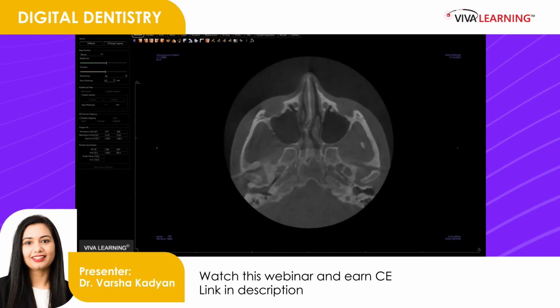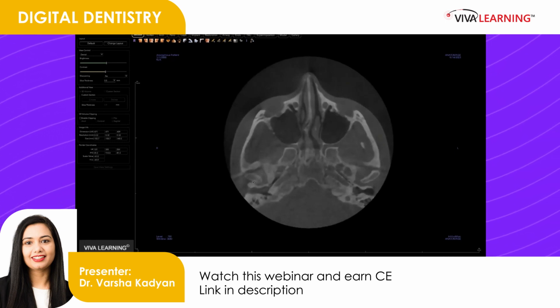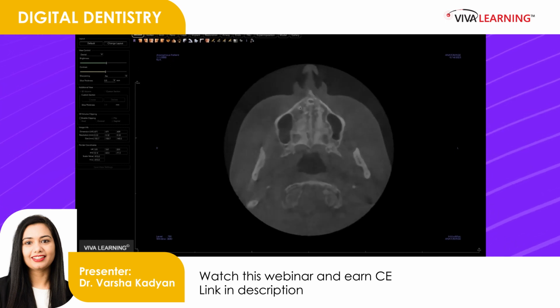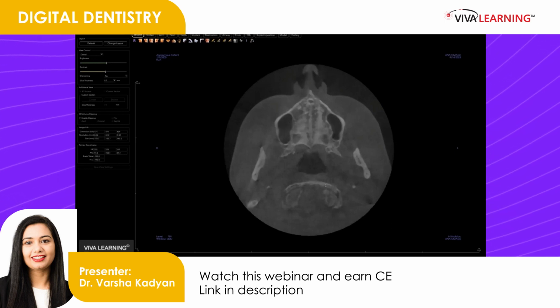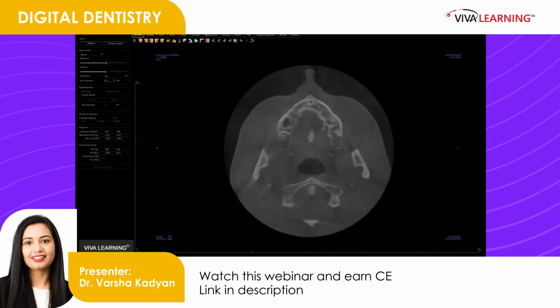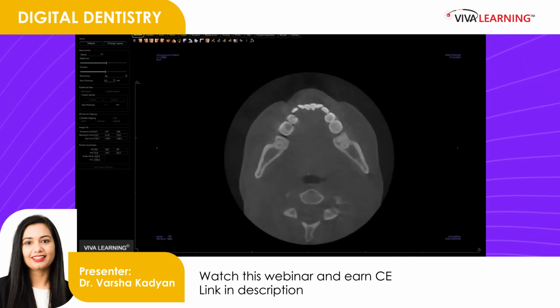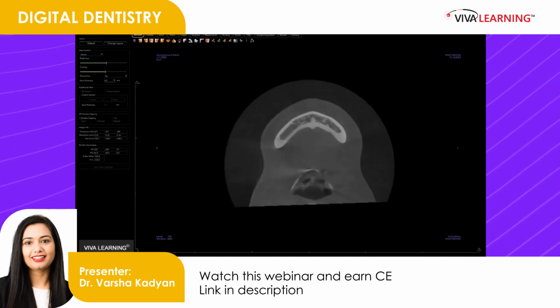These are the mandibular condyles here bilaterally, which are positioned in the middle of the mandibular fossa. And the maxillary arch, we see the hard palate here, right maxillary sinus, left maxillary sinus, coronoid process of the mandible. And this is the C2 odontoid process. This is the oropharyngeal airway. And this is the hyoid bone.